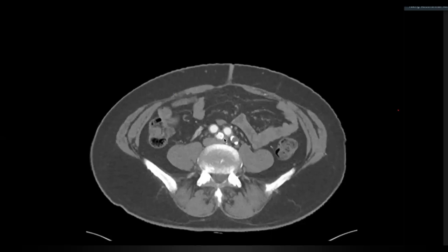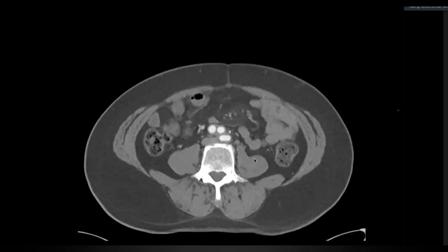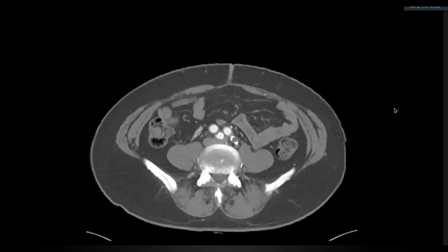So what are these then? This is the aorta that has divided, right? Yes. So what divided into what? What are these called? The aorta divides into what two branches? So the two common iliac branches. Okay. So these are two common iliac branches, and you can say that they're heavily calcified.